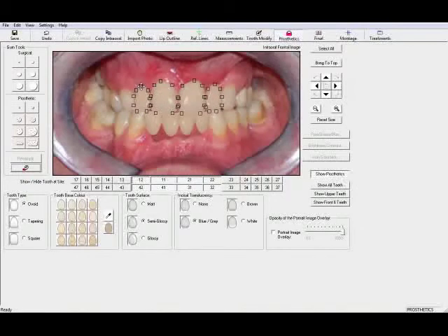By using this point here, we can change the zenith positions. If you notice, they're moving away from the center line, which is the natural position for them. Also, what we can do is change the gloss, namely we can go from glossy to semi-gloss. We can also change the shape of these teeth from square, tapering and back to ovoid, which is the best one. The next aspect is that there are gaps between the prosthetic teeth and the gums.